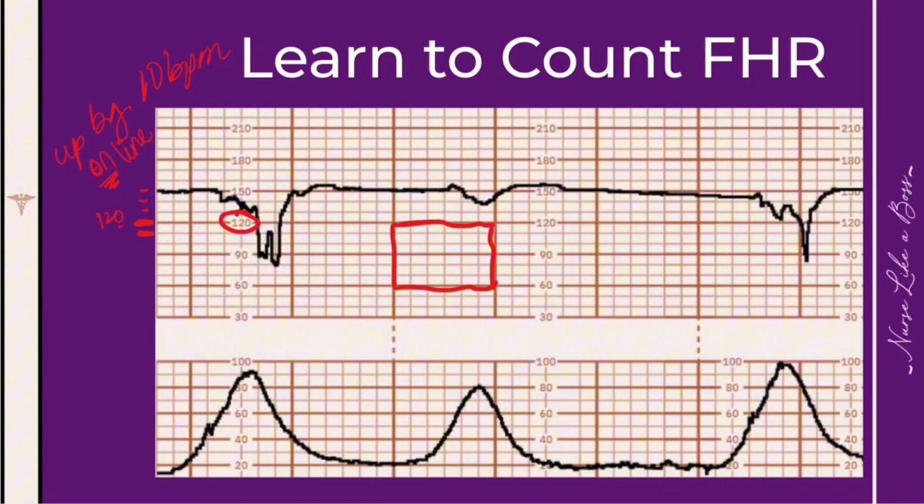I'm keeping the red box on the screen to represent that 60 seconds or 1 minute just for reference and reminder. So the boxes above the white space is where the fetal heart will be. And sometimes you will also see the maternal heart rate there if mom is wearing a pulse oximeter.